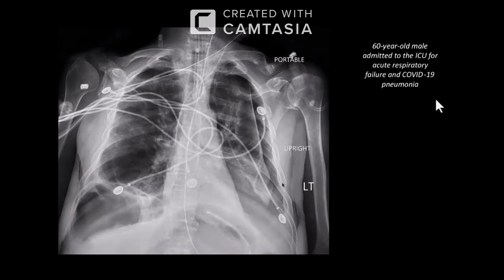Okay. So let me give you my side of it. Let me describe it for the other candidates, or for the other students. You have started very well. I always prefer to tell this finding first, because the pneumothorax is more urgent and very important.